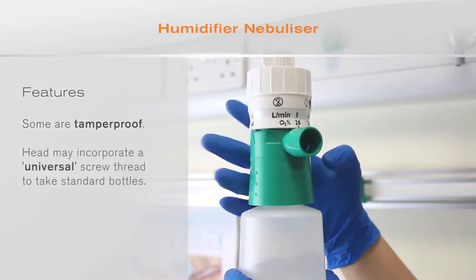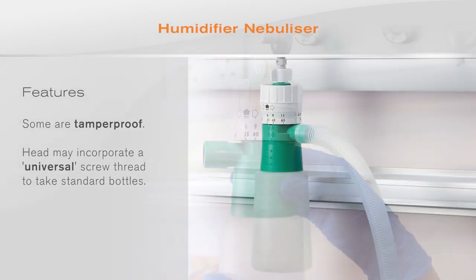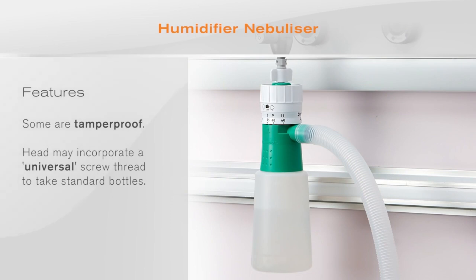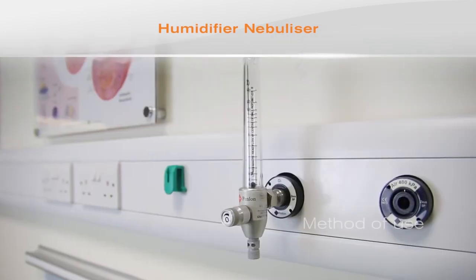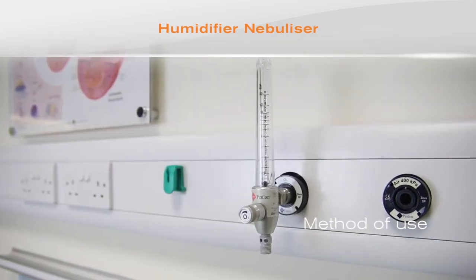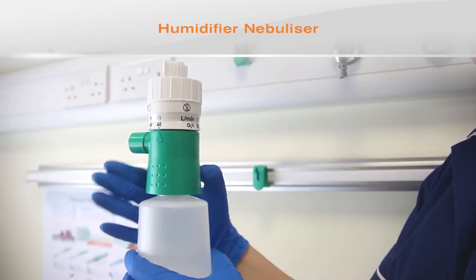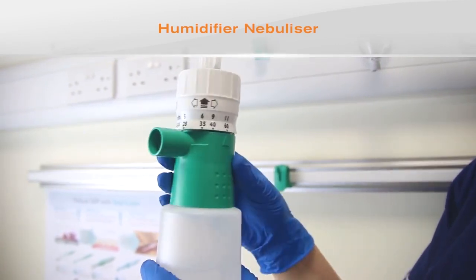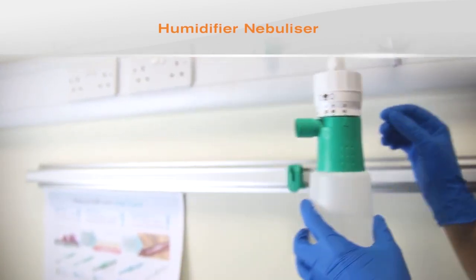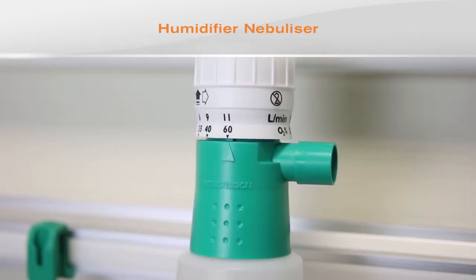The head of the Aquamist nebulizer humidifier incorporates a universal screw thread. This permits the use of a bottle which can be refilled with sterile water, or the use of some pre-filled sterile water bottles. The flow meter should be attached to an appropriate oxygen supply. Fill the bottle with sterile water using an aseptic technique and fit to the humidifier head. The humidifier nebulizer should then be attached to the flow meter.